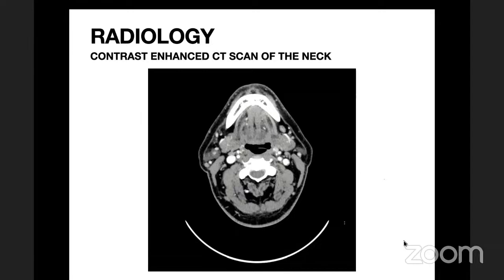And here actually the stomal size as well as the prosthesis that you've placed are also important considerations, because as a result of radiotherapy, there may be peristomal reactions which can lead to narrowing of the stoma as well as the prosthesis. You'll have to look after it well.